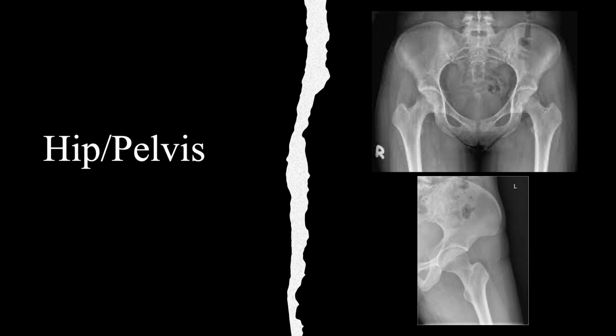Then you look at the main pelvic ring. Make sure that's intact, there are no fractures. Make sure that the SI joints and the pubic symphysis all line up. Then I like to look at the outer ring of the pelvis, so I go all the way outside, and look again for any fractures or disruptions or dislocations that there may be.